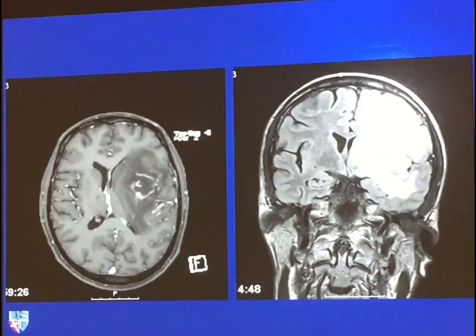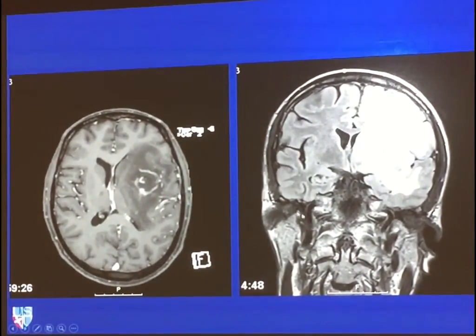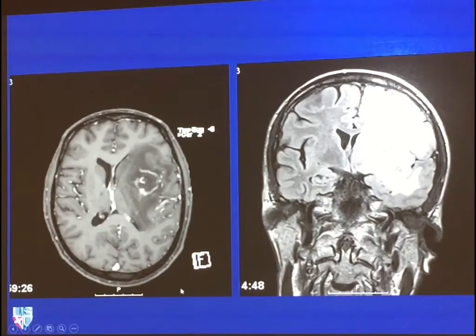Okay, so here are two images trying to highlight what the findings could be in kind of the best case scenario. Here's our FLAIR image. This is coronal. You can see all this bright vasogenic edema, very angry brain surrounding the lesion. When we give contrast, the edema now is low signal intensity because it's a T1 weighted image, but we see this peripheral enhancement forming almost a complete ring. But the bullseye is not right in the center, right? So this is supposed to be the asymmetric target sign, with the bullseye shifted off to the side, and this is supposed to be pathognomonic for toxo.